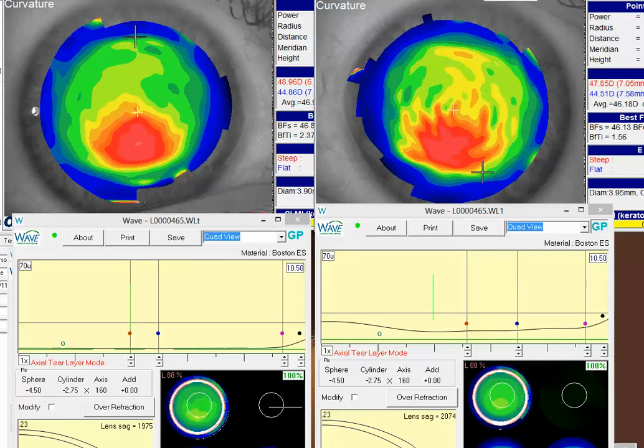I see from your clinical request that you're having some difficulty with this keratoconus patient, with some unexpected overrefraction and some concerns over the optical zone in this patient. So if we look at the designs, because this cone is displaced inferiorly, you have a couple options. One is to try to use Wave to go over this area and try to match it very precisely, or the other option you're hoping to do is go to more of a spherical back surface.